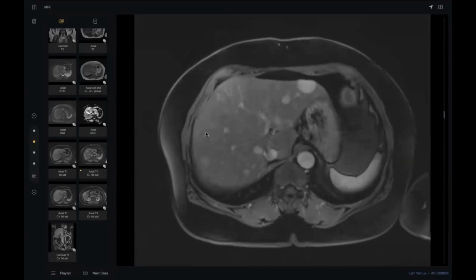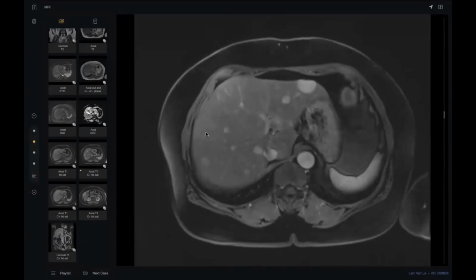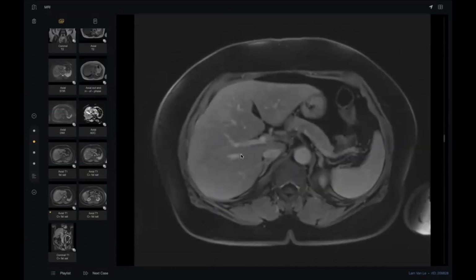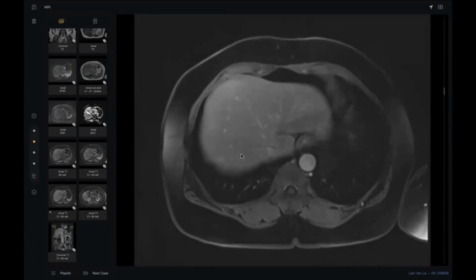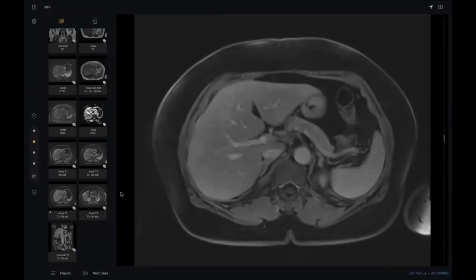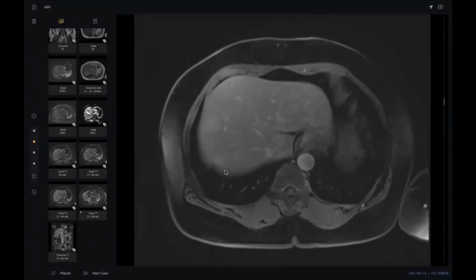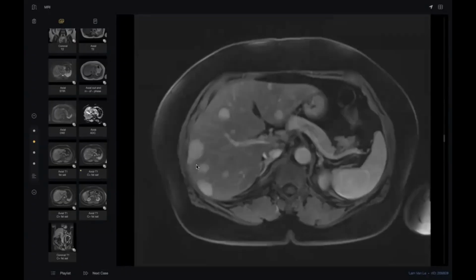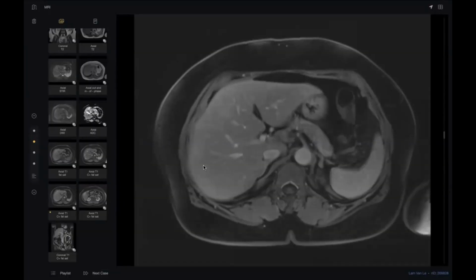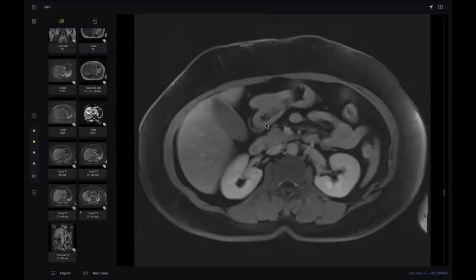What are the benign hyper-enhancing arterial multiple focal lesions? Adenoma or FNH? So I should revise the venous phase. Oh, doctor, it becomes nearly similar to the parenchyma of the liver. Nearly similar, iso. Okay, so FNH is on top of my differential. In delayed, the same. I will conclude how to diagnose FNH: it is hyper enhancing in comparison to the liver parenchyma in arterial phase, then it almost follows the liver parenchyma. Okay?